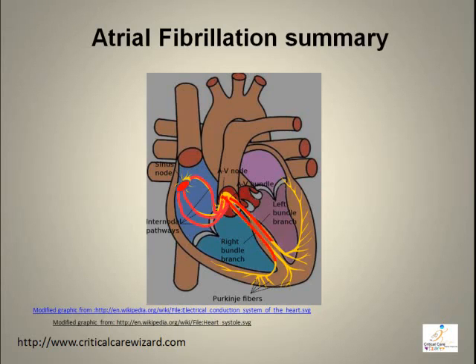Normal conduction with ventricular response. Atrial fibrillation may start anywhere in the atrium. This abnormality presents an indiscernible shape of the P wave in the ECG paper.